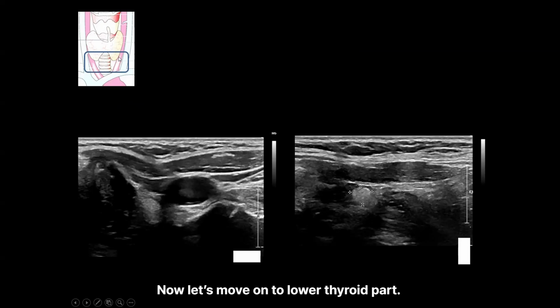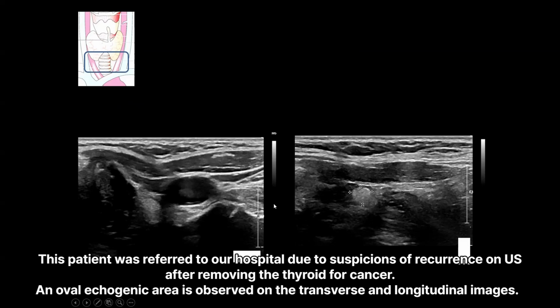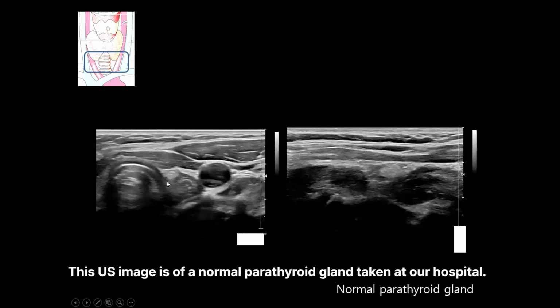Now let's move on to lower thyroid part. This patient was referred to our hospital due to suspicions of recurrence on US after removing the thyroid for cancer. An oval echogenic area is observed on the transverse and longitudinal images. This US image is of a normal parathyroid gland taken at our hospital.